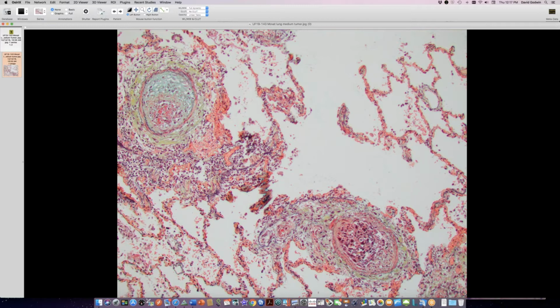Wow. So this fellow didn't really have a chance. And this disease, his CT scans had been getting worse over a period of a few weeks. He had about a 5-pound weight loss over some time. It was not intentional weight loss. So I've seen one previous case of this, I think. It was years ago, and it was very small central lobular metastases. And I don't recall whether that person also had a thrombotic component, but the malignant cells were causing this localized thrombosis. Is that cool? Have you guys encountered this?